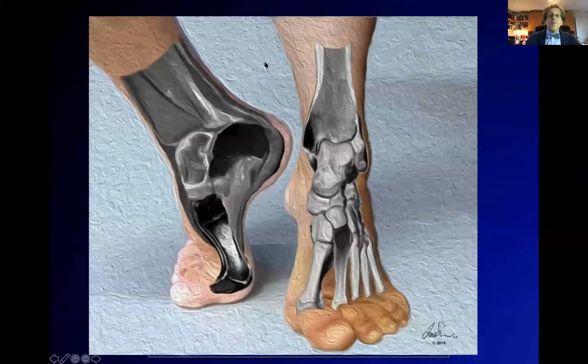features. So, okay, remember, here's our picture. I want you to think about all the conditions we've discussed so far, and in this MRI section, you should be able to complete your identification of these images.